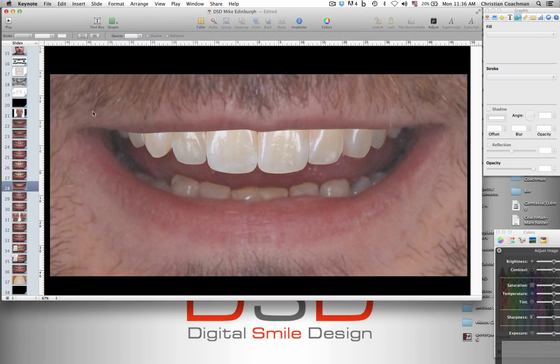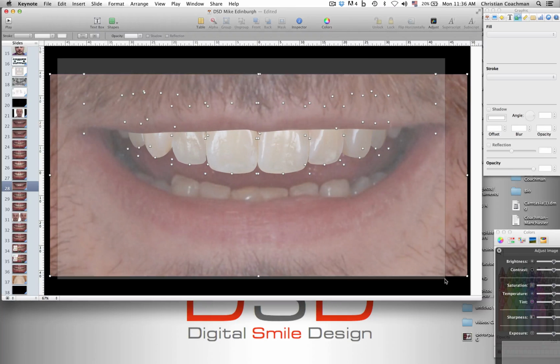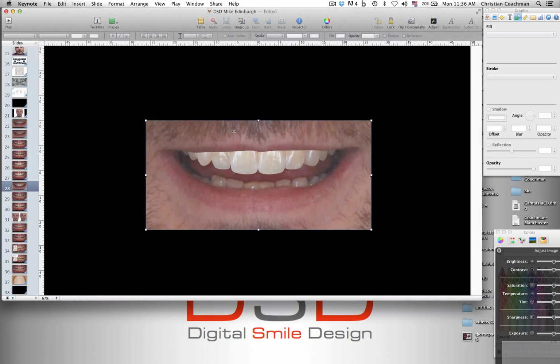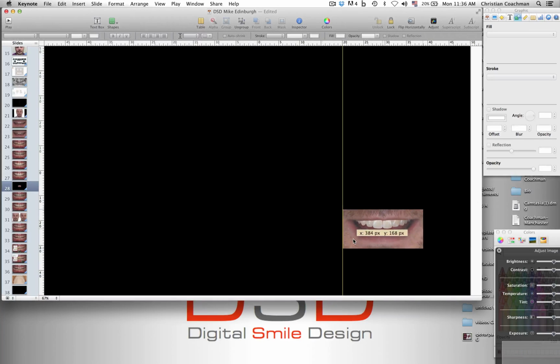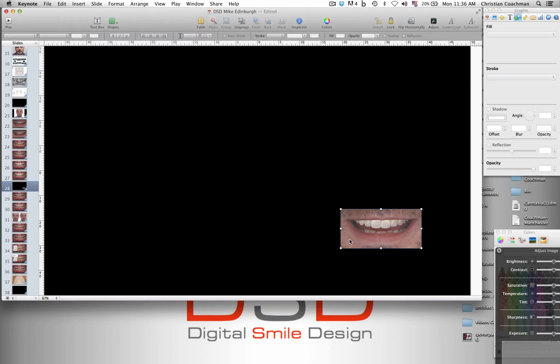Yes. Okay. So now the thing that you want to do is to zoom out to see the patient's face. So if I select everything and I group, I can make them small enough so I can fit the face in half of the slide. So if I double click on the picture here, I will show.